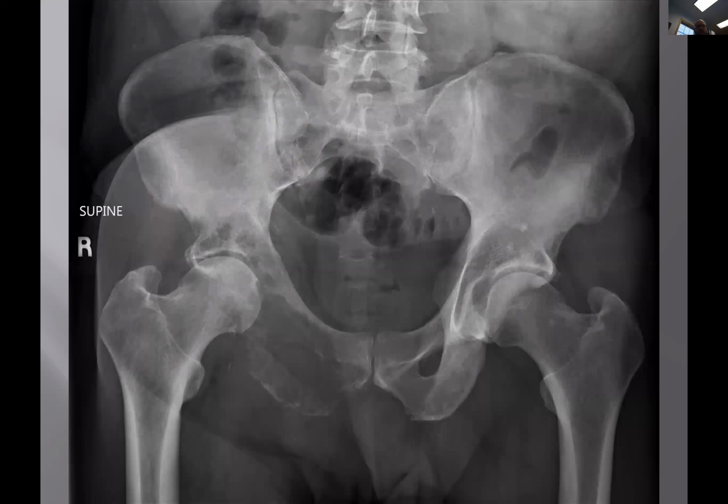So you can see the right hip and the left hip. The right hip is, of course, marked. So which hip looks abnormal to you, the right or the left? Right. Yeah, I mean, guys, what do you think? Do you see the abnormality? Obviously, there is something that makes your heart start beating quickly. Do you agree? Yes. Yep, and this was just a week and a half ago, and take a look at it.